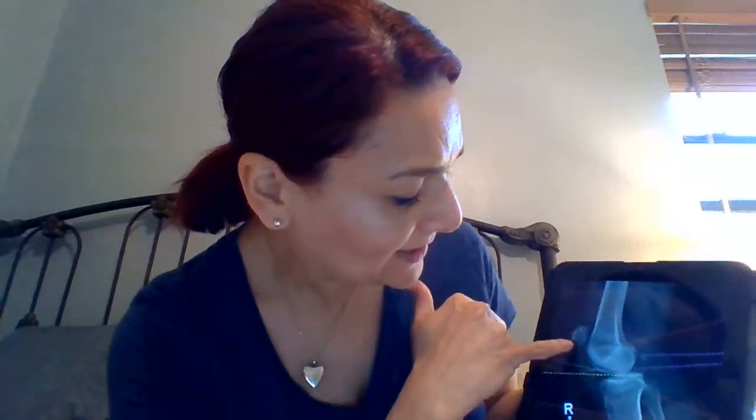And I also made a notation of the calcification, which you can see this very large one here in the posterior aspect. The white area, anterior and posterior, showing calcifications. And it's really hard to tell because the lines are coming through, but you can see the tendon that stretches from the patella to the tibia. There's calcification there, and they're just very faint white specks.